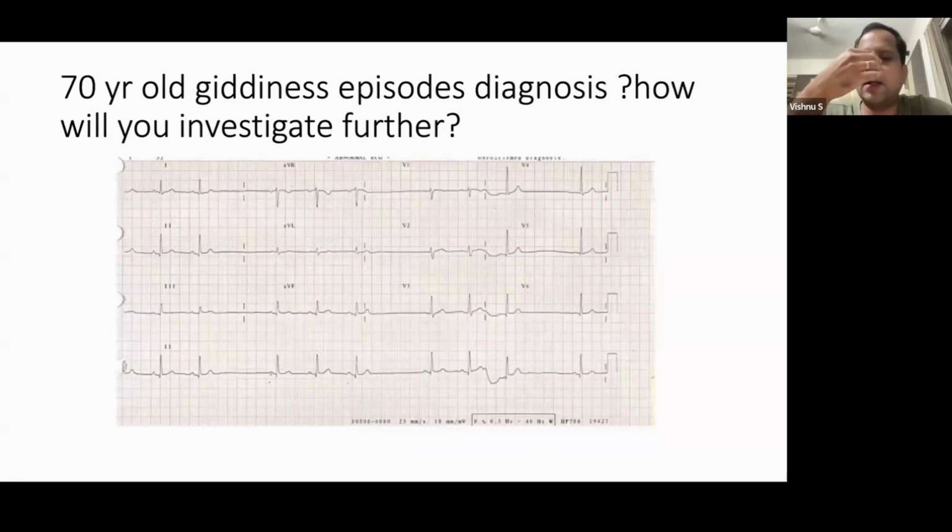Here, is the PP interval changing? Focus on the PP interval. Then focus on the pause. And the PR interval also you should see. Can anyone tell?